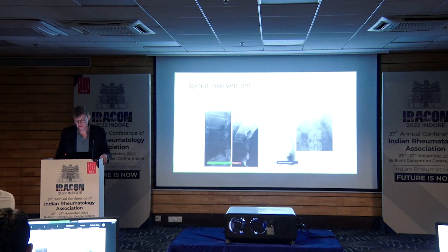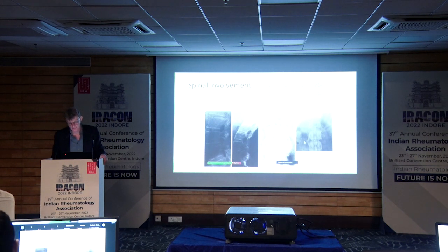In other conditions like psoriatic arthritis, it may appear a bit different, in that some of the syndesmophytes are more bulgy, like what you see up there, going a little bit more to the side before going in again, and it's not as symmetrical. So it's an asymmetrical pattern of parasyndesmophytes or non-marginal syndesmophytes we see there. But this is a pattern. But this is late stage, of course.